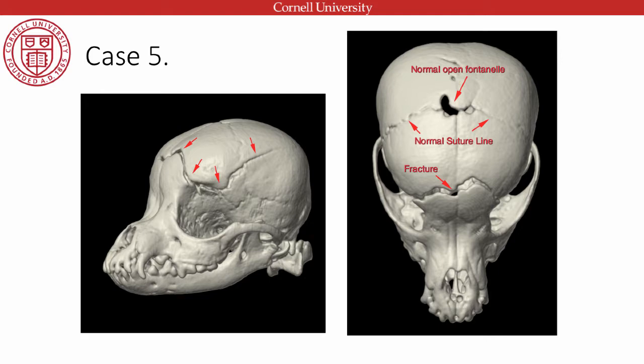Open fontanelles, sometimes they never close. In the really dome-headed Chihuahuas and mini breeds, they sometimes never close. So just being aware that might be patent. And particularly she's a young dog, so she does have a patent fontanelle.